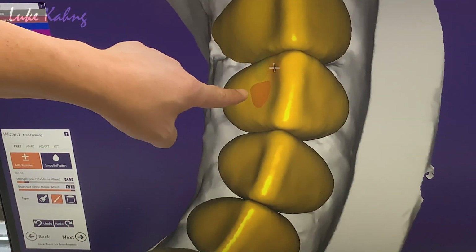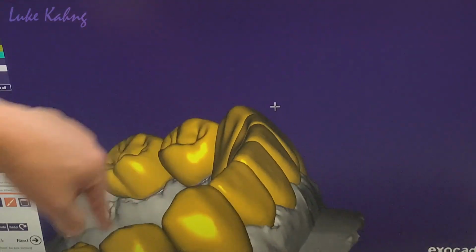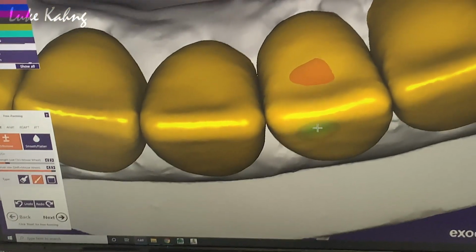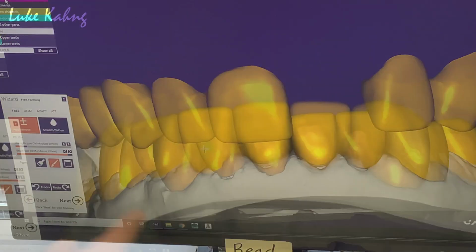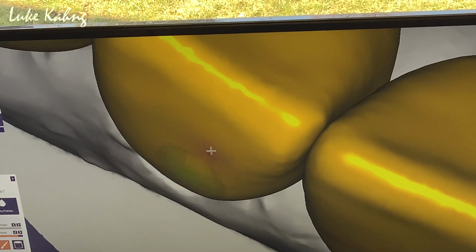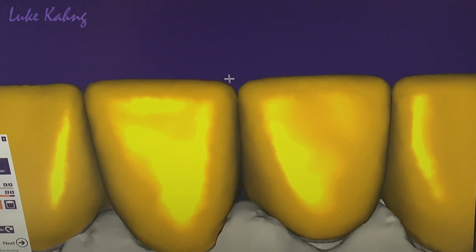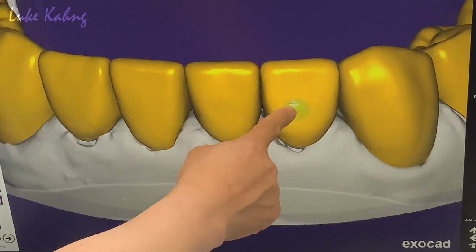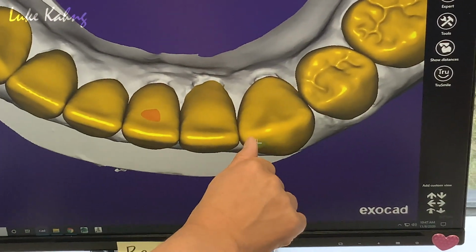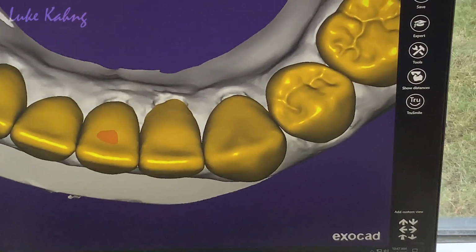Okay, yeah, getting better. I need a little bit more out. Just like that. Now, same thing, central. It's not too short. See, make it slightly added. What I'm saying, this is a standard, and then I tweak. Same thing here, flat, right? Look at the canine occlusion view. It's really wide, so you can cut it, move the line angle in this direction. Yes, and then here too, especially. Then we can decrease the width.